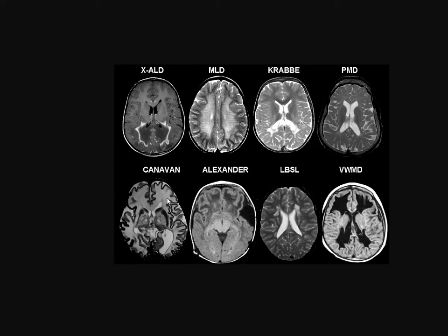Then we talked about Pelizaeus-Merzbacher disease, which is very similar to MLD. It also has a tigroid appearance, but however, in this section you can't see it. What you can see is that there is atrophy, and if you were shown the cerebellum, you would see that there is atrophy of the cerebellum and possibly the brainstem also. In Krabbe disease, you have bithalamic involvement. There will be hyperdense thalami on non-contrast CT, and also you have a halo around the dentate nucleus.